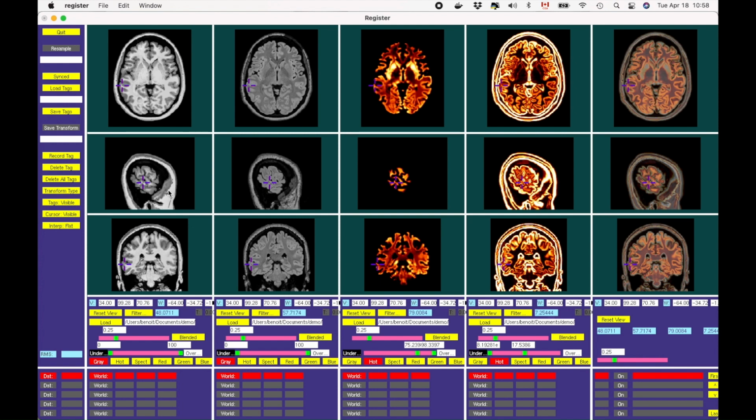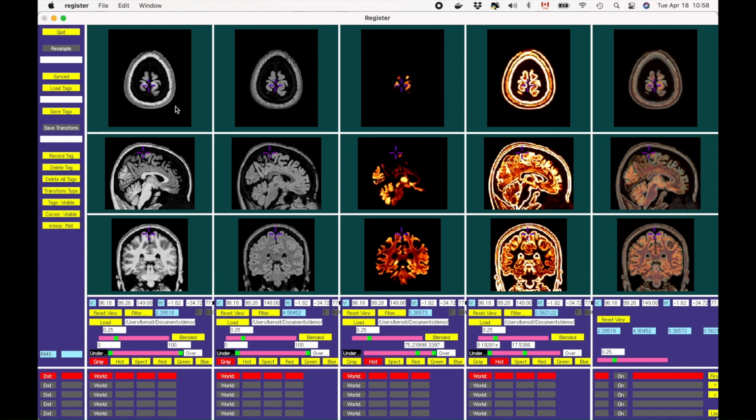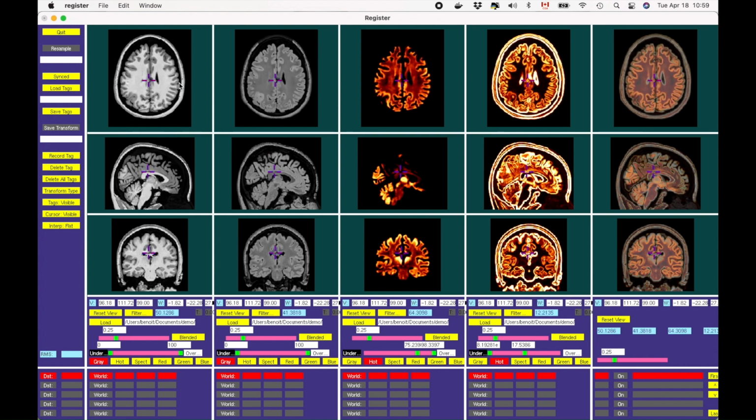In this first exploration, I didn't find anything visible, but let's start again. We start again from the top of the head, in the axial view, and I move slowly again, taking care of what's going on in the image. And during this exploration, it looks like I'm starting to see a possible candidate.